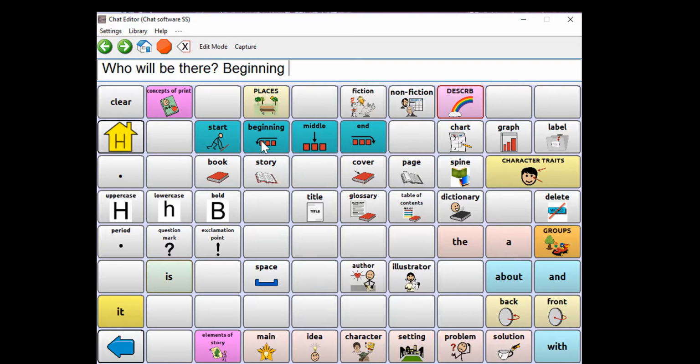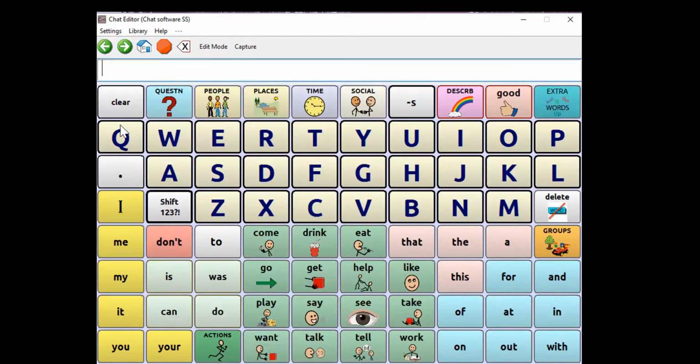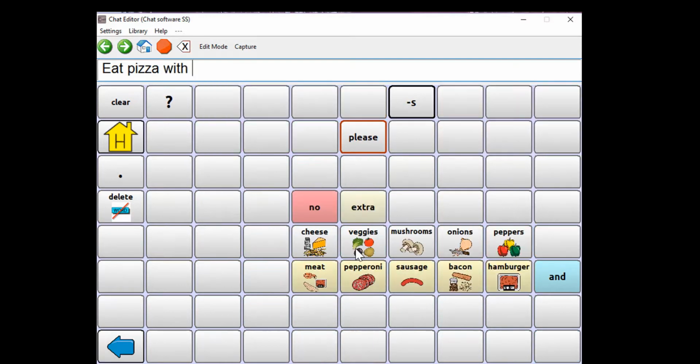Beginning. Character. is. Fun-loving. Beginning character, he is fun-loving. Eat. Pizza. With.